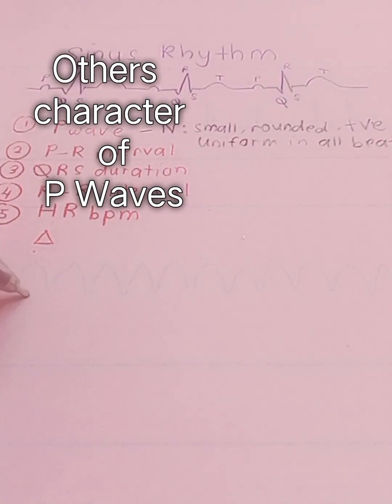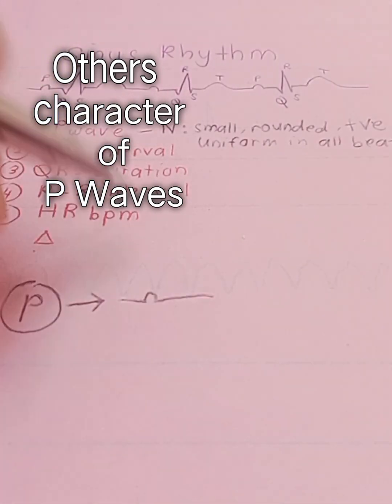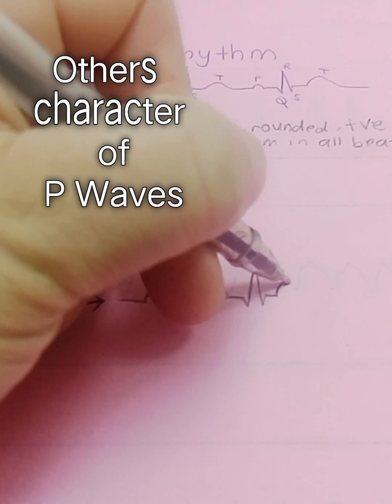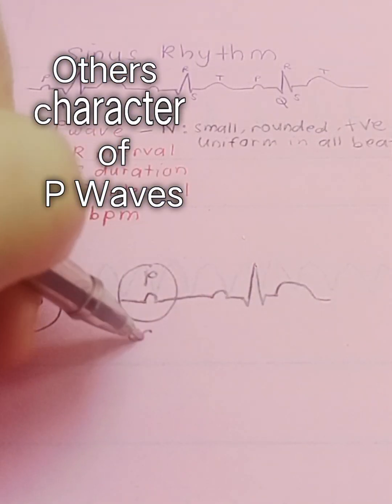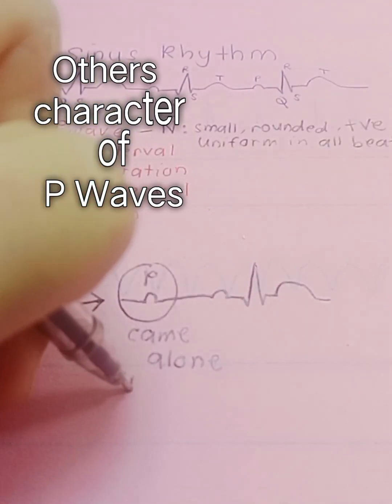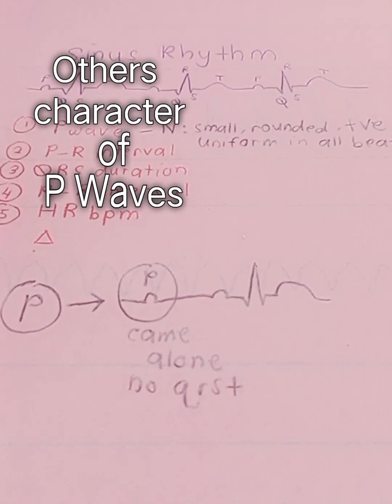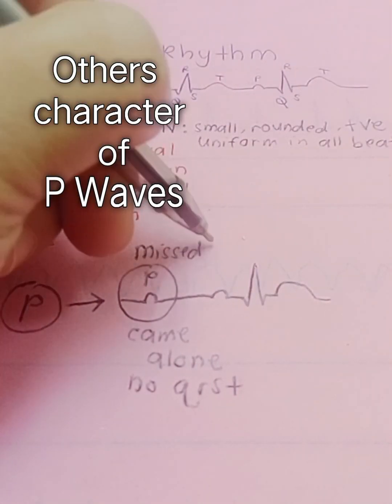But P wave can come alone. Only have P but no QRST. P came alone, no QRST. So this is what we call a missed beat.